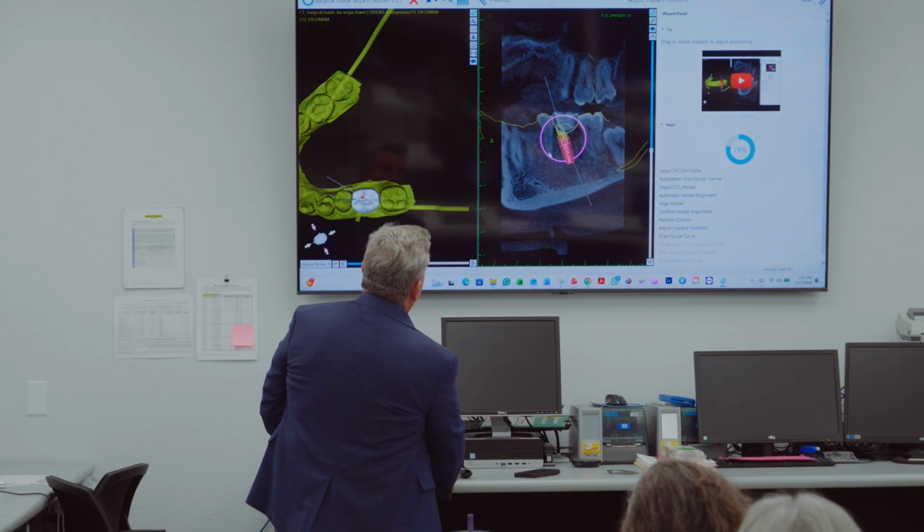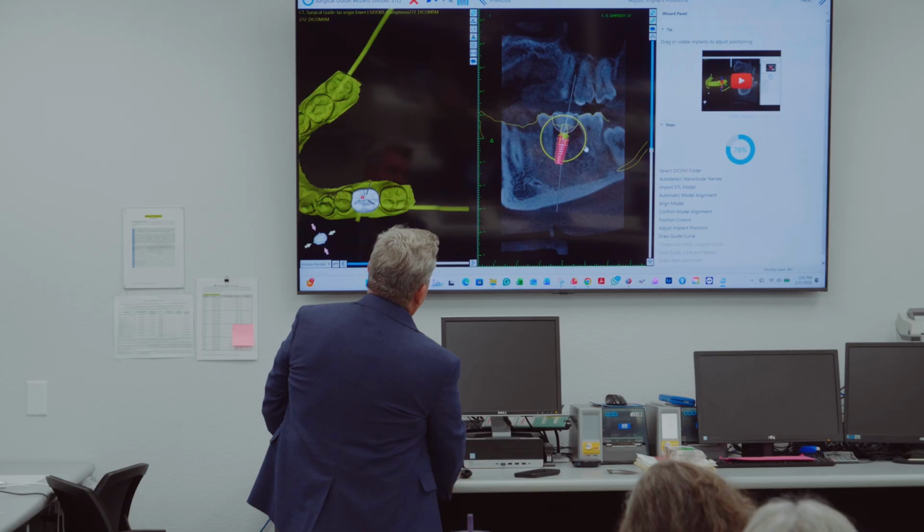I don't know why it's not clicking over there. It should be changing that. Well, I'm going to figure out why that's not doing it. I'll let you know. But anyway, there we go. So we're back to that. Let's just get past this one.